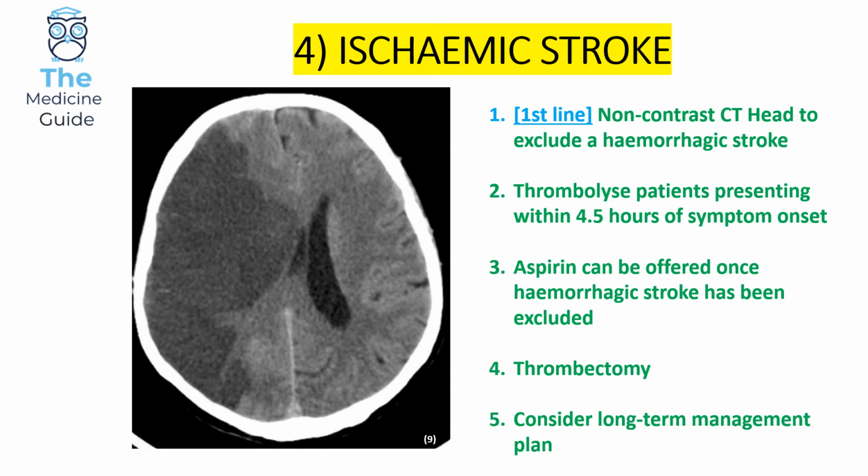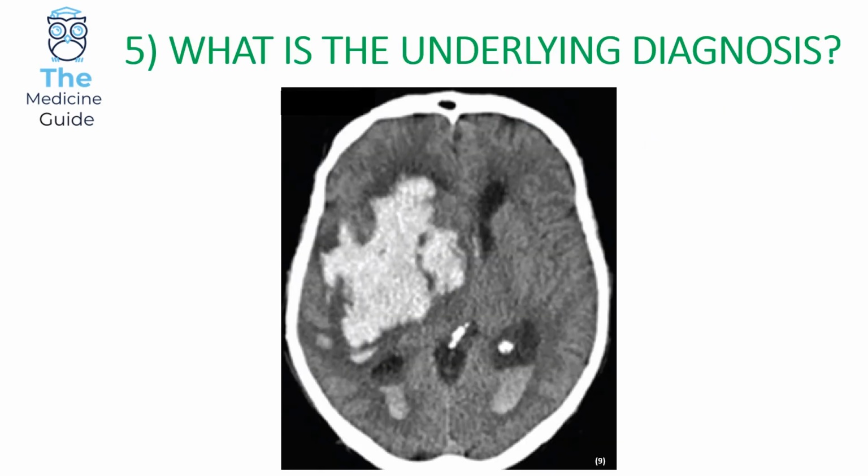Then we would consider thrombectomy, and finally we would liaise with the other members of the multidisciplinary team to consider a long-term management plan for this patient. Okay, so let's have a look at the next image. I'll give you 10 seconds for this.